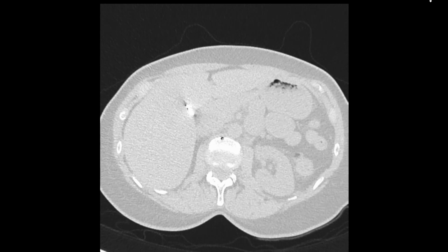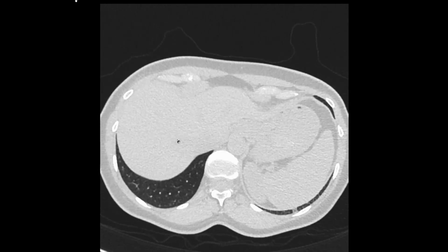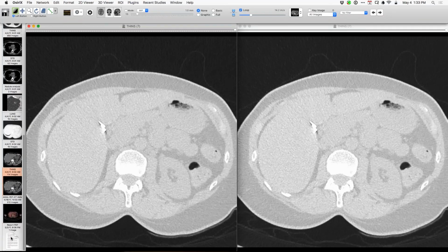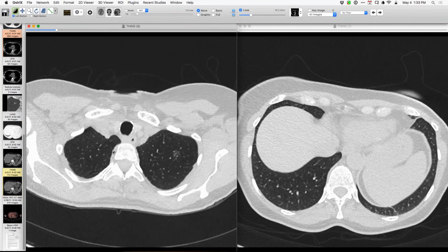Rolling in the wrong direction, or what's going on here. There must be another sequence that I have to bring up. Let's try this one. Sorry about that. For some reason, I have something wrong. Oh, maybe it's here. Sorry about that.